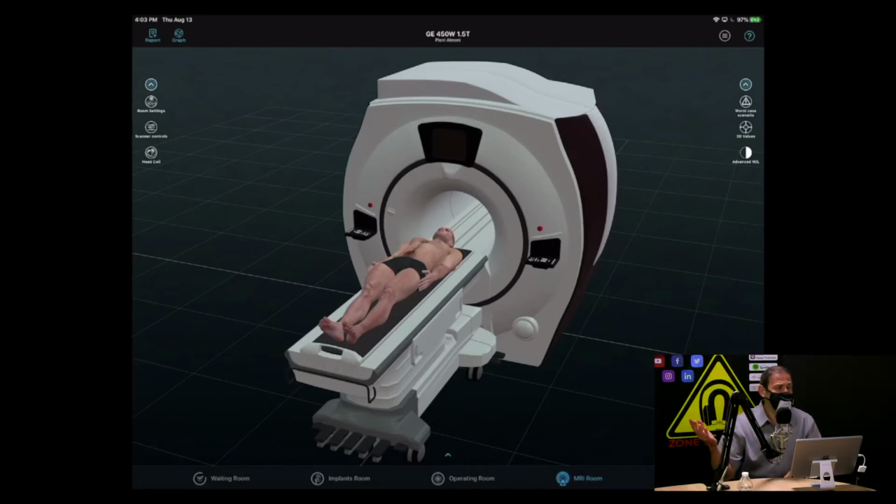So now you're in the MRI room, and you can pick whatever magnet that it models. We model a few dozen. In fact, right now, General Electric just told us that about 85 to 90% of their installed base worldwide is now modeled in this app. Coils as well? You can choose from amongst the scanners, pick them, and they'll be in the app and available.